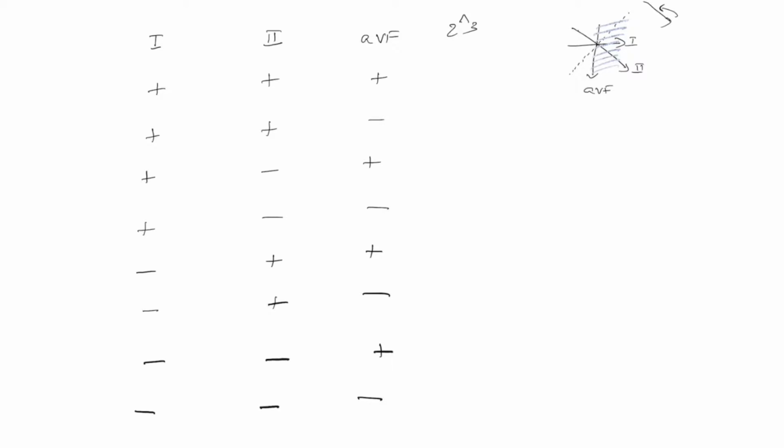Lead 2 is positive, so the axis of QRS would be somewhere here. And AVF is positive, so the axis of QRS would be somewhere here. So based on all this, notice that the area of overlap is this specific area.